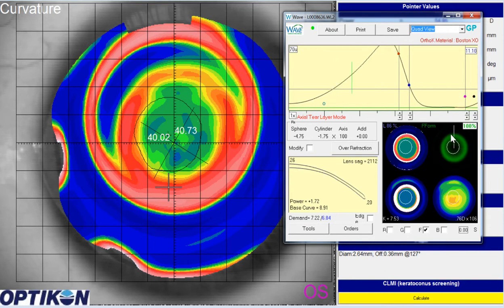Well, maybe not. So it's a little bit thick because of the prism we added in. And then now I'm just going to go up to here. And what we're going to do is increase. Actually, before we do that, we want to go into 25% mode. Actually, I'm going to make this 50 because the change drifts a little bit over towards the horizontal meridian too. So we're going to increase sagittal depth here. And then inferiorly, we're going to decrease it. So I'm going about 8 clicks in each meridian.